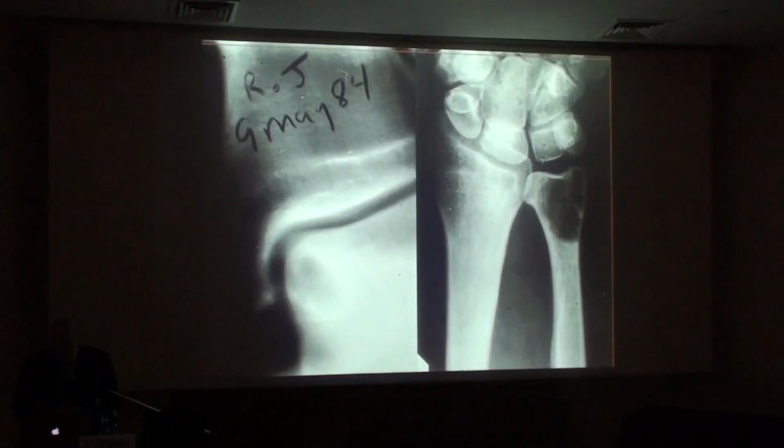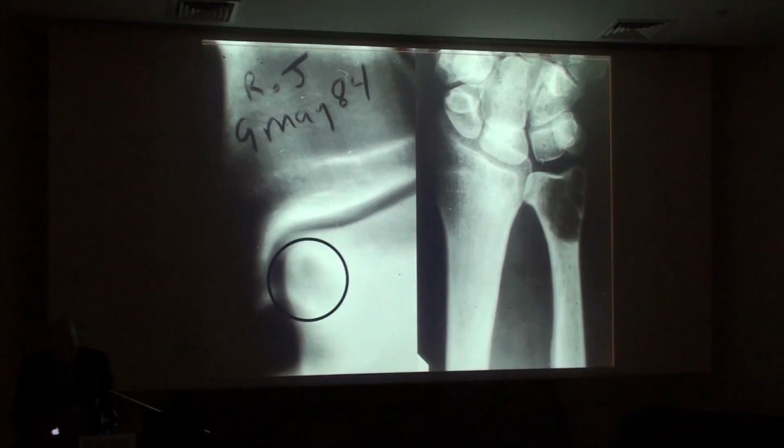Two additional cases. This one is in a young patient, and you may remember the term intraosseous ganglion. That term, as best as I can come up with from talking to the people at the AFIP in orthopedic pathology many years ago, was used because they found these lesions in younger people adjacent to the articular surface, but they had no degenerative change on radiograph.